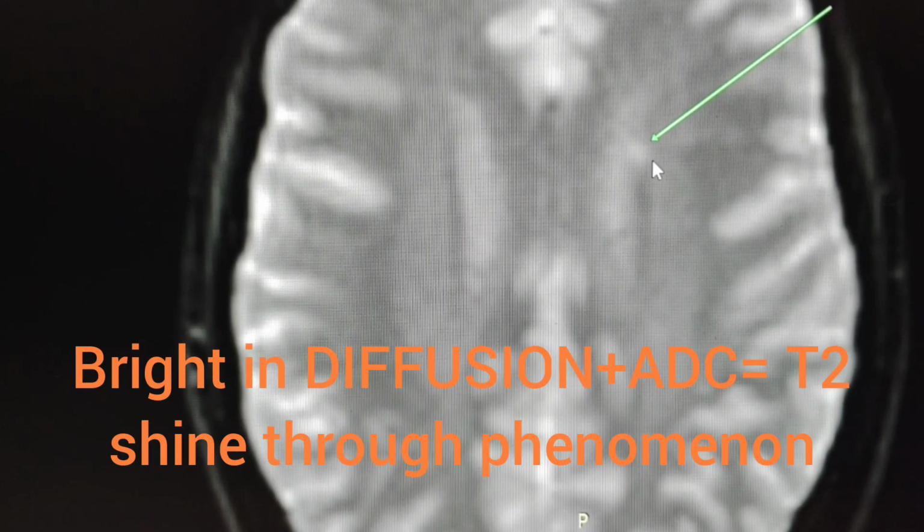When you see in the brain a bright lesion in diffusion weighted imaging and also white on the apparent diffusion coefficient, the ADC mapping, it is a typical finding of T2 shine-through phenomenon, and it indicates that the tissue has normal or increased water diffusion rather than restricted diffusion, and this is very important to differentiate.